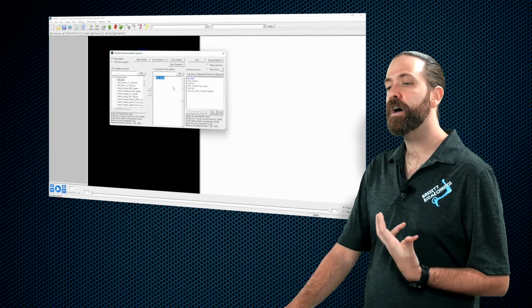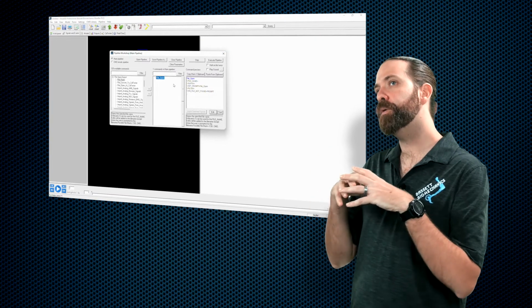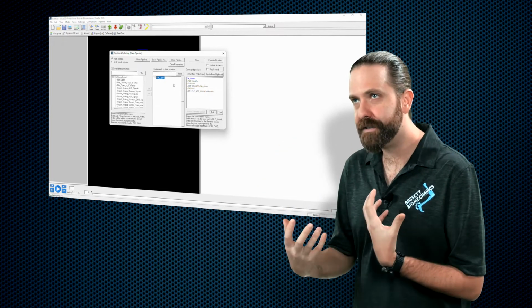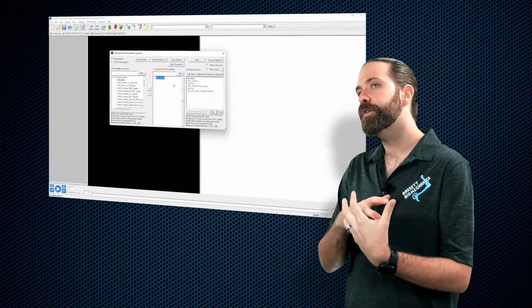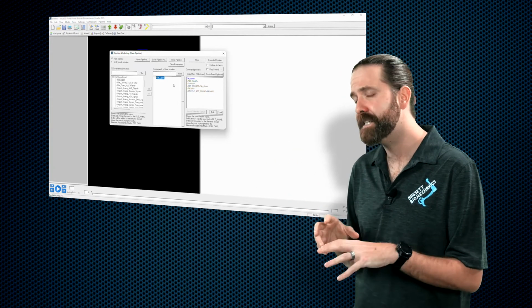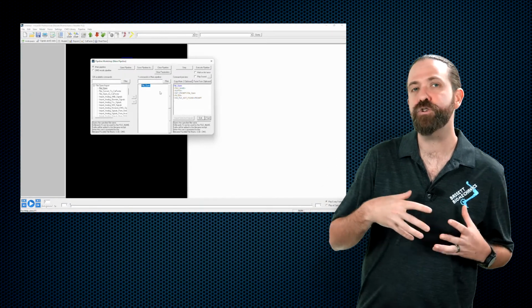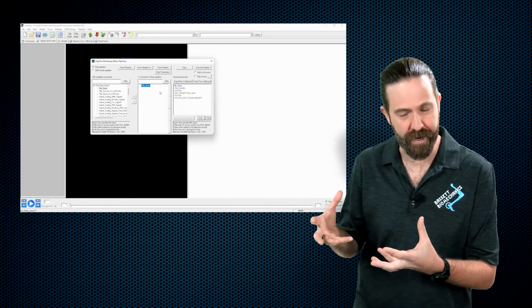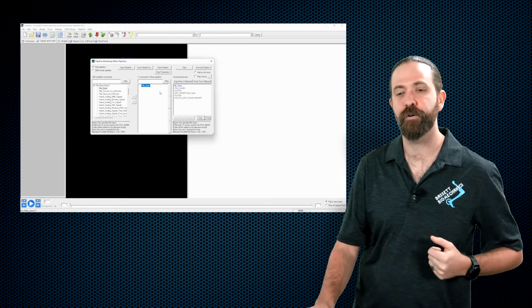All of this is a way to make processing your data easier. Throughout this course, you will learn how to do that, as the first time you look at it, it might seem intimidating. The purpose of all this is to show you that it is not intimidating, you just have to learn how to do it. And we're going to focus on that.